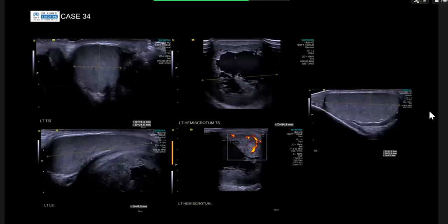Okay. So when you're ultrasounding this, you can get above this complex area. So there's no evidence of it going into the abdominal cavity. It's just within the scrotum. So it could be a congenital septated collection.